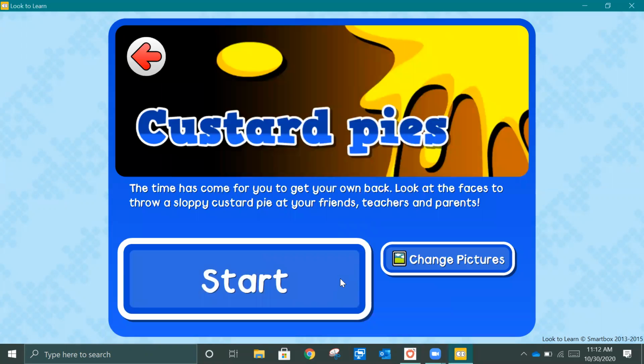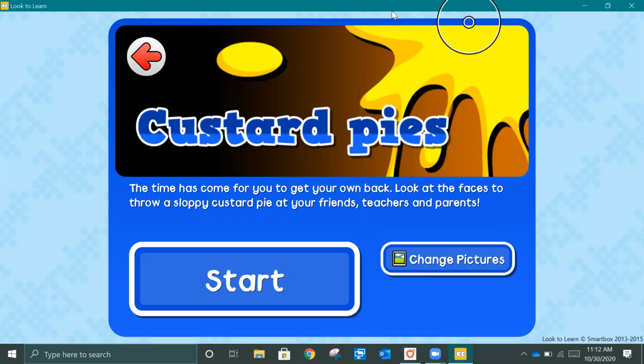If the user can do it, they can look past their eye tracker at the bottom of the device. It's going to bring up this menu bar. And what I want to do is turn on this continuous left click. So now anywhere I look, it's mouse emulation. So it's not even a left click.